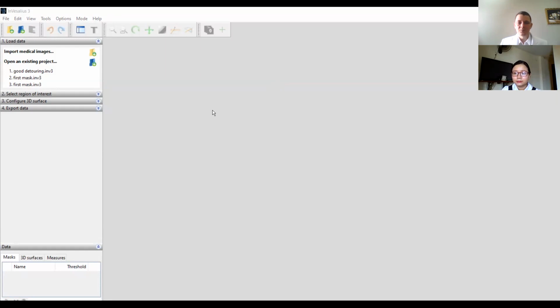So first you have to add a file. You will see, super easy. We add a file first. Đầu tiên thì mình sẽ chọn file trước.